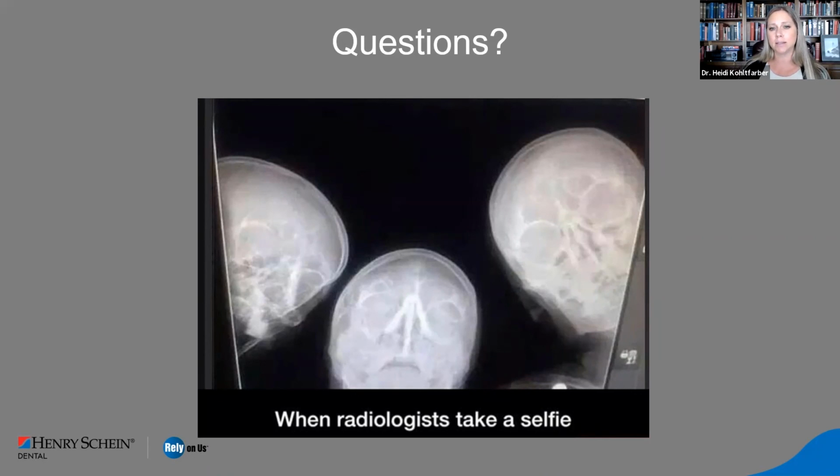Again, we can't see the soft tissues. We're looking for some type of pituitary pathology in that area, and we're really going to need to send them on for an MRI to look at the soft tissues and see what's truly going on. Many times, if they actually do have a soft tissue tumor within the pituitary gland region, you're going to see that the sella turcica is expansile. Those cortical borders are expanding down into the sphenoid sinus.